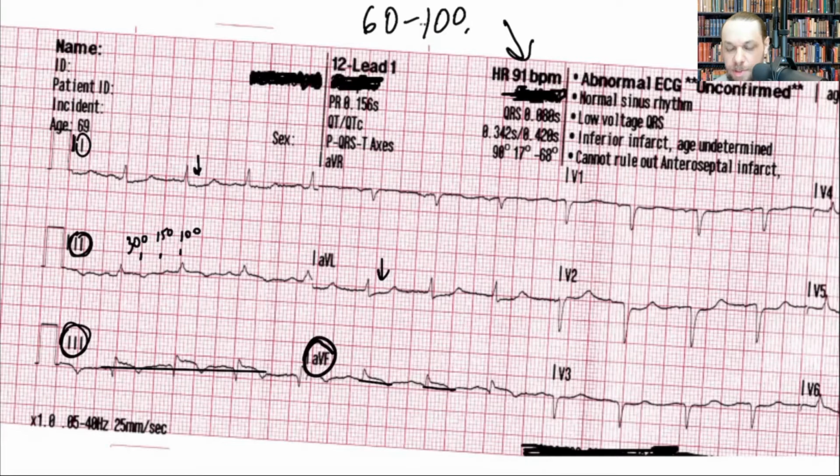symptoms of that nature, you want to run a 12 lead EKG for them to find out if they have MI or not. So this person definitely went to the cath lab, but this person did not have chest pain. So if you dismiss their GI complaints, you dismiss their fatigue, and you don't run a 12 lead, you will miss your MIs, and they're not always like tombstone type, fireman's hat type deal, big. Sometimes they're subtle, but there's enough elevations to diagnose this, right? So that's how you want to look at the EKG.